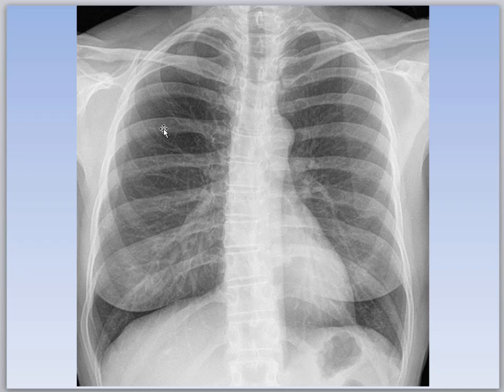Okay, so again, if I put a sticker right here, is this a posterior, lateral, or anterior rib? Again, that's posterior. The posterior ribs are always more transverse, more horizontal. This part here would be the anterior part of rib number 2 if I put a sticker there.